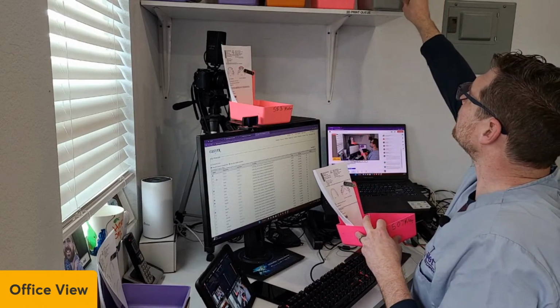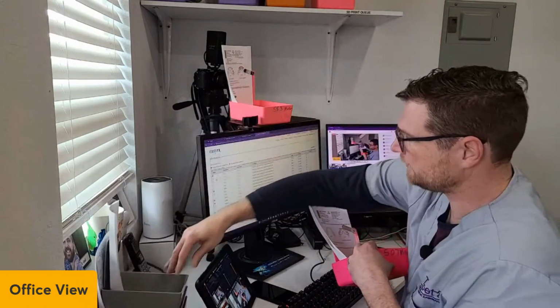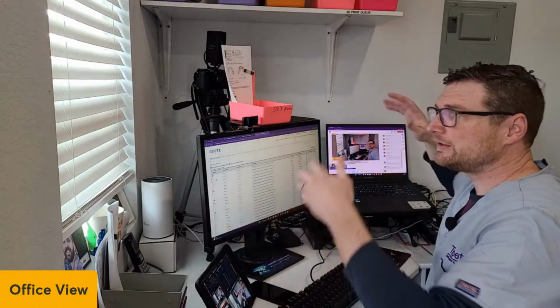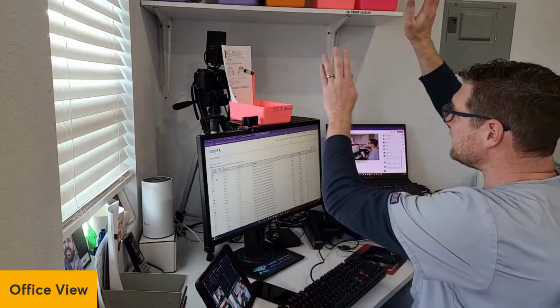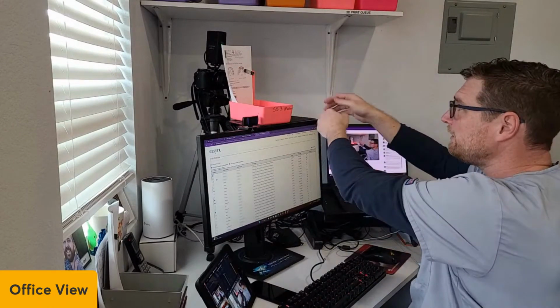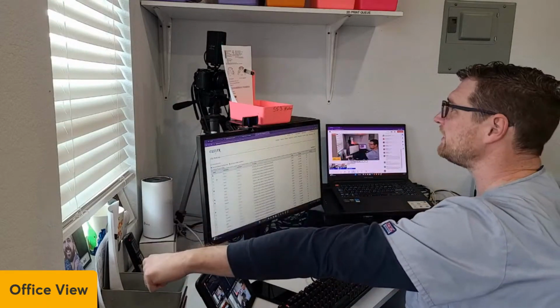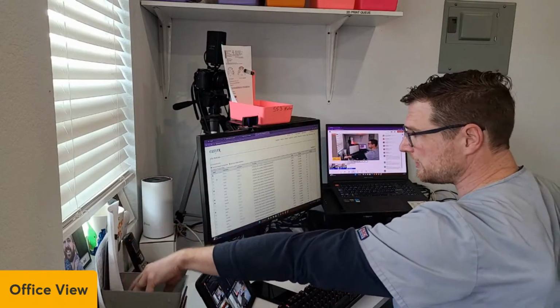I'm going to put this one over here. You've got to do an organization, or else you're going to get off. So I take the 6 I'm going to try to print. I put them here, and then as I click them off on this side over here, I put them on my left-hand side, and so I know I do have these clicked.